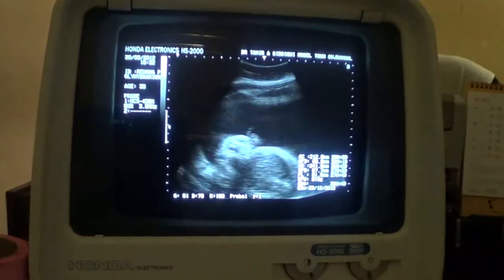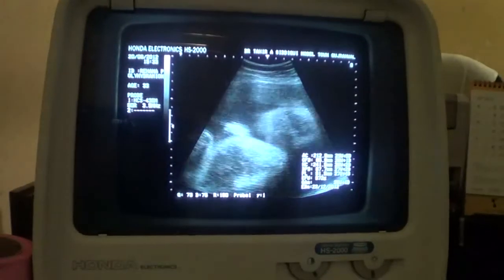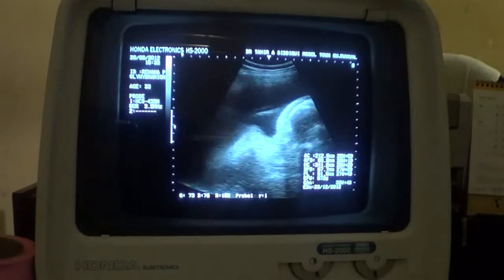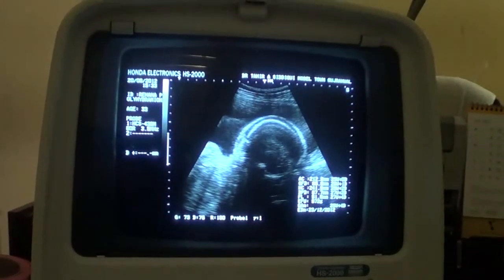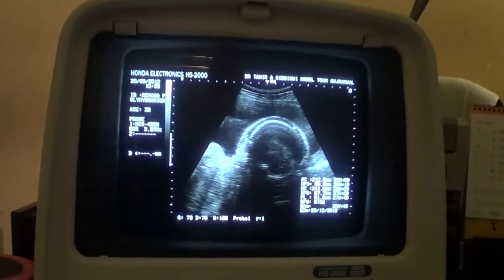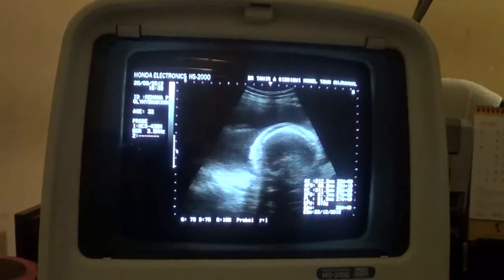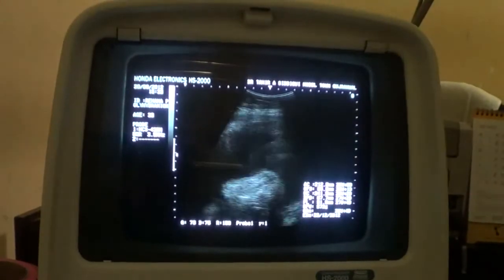Is there any sign of fetal distress? Or did the fetus go into distress? Meconium. Do we see meconium? You see, whenever you see a double line or double cranial outline, it is always suggestive of intrauterine fetal demise, and along with it you can see there is overlapping of the fetal skull bones.